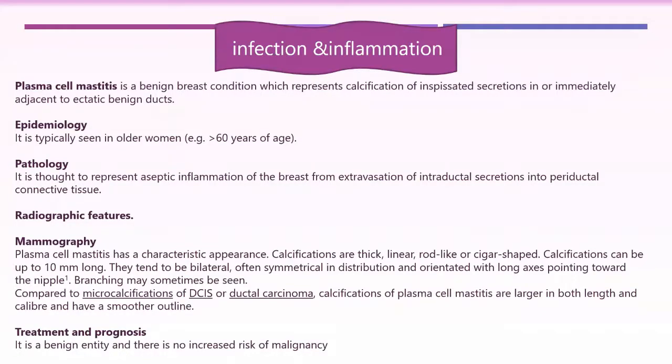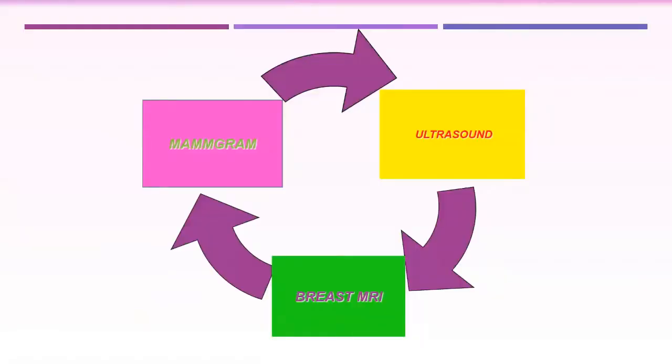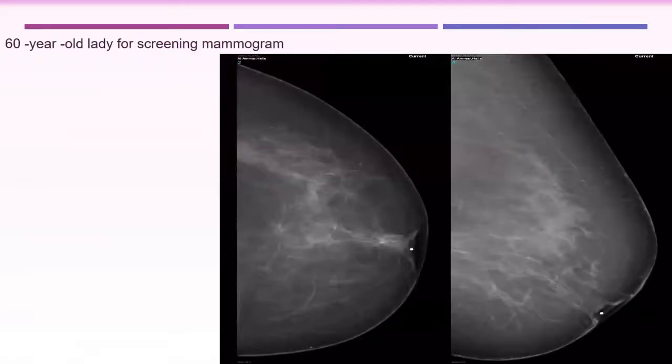Here in this case, it doesn't show a suspicious feature, but sometimes it might be associated with periareolar skin thickening, especially if it is unilateral, or can be associated with other things. What's the suspicious feature in this case? Skin retraction, skin thickening, and nipple retraction. The thickening and retraction of the nipple areolar complex is a common feature characterizing this entity of benign inflammatory process.